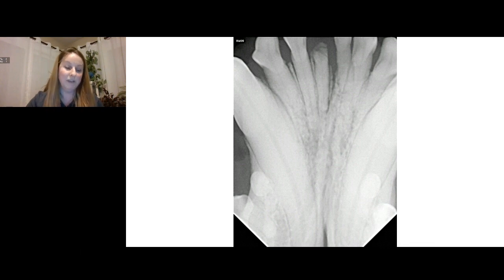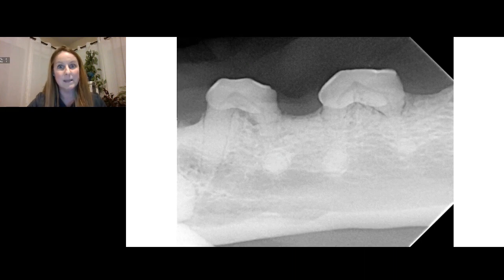This radiograph is mandibular incisor teeth in a dog, very similar to the radiograph that got me started in veterinary dentistry. There's a tooth root right there. Similar to what I found in a patient when I was developing dental radiographs by hand. I found something like this, and I referred that case to a dentist because I didn't know what to do. So it's jagged, it needed to come out, right? So when we see tooth roots that are there, we need to get them out, particularly if they are jagged and look like that.